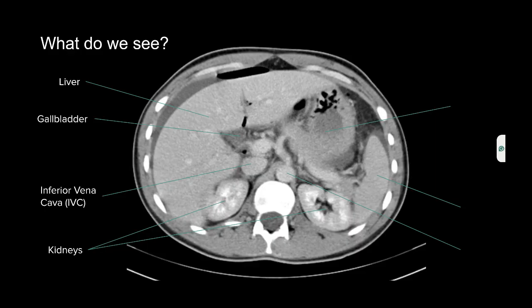Now, to our patient's left, at the top, we have our stomach. And then down a little bit lower to the patient's periphery is the spleen. And then this vascular structure near the center is a pretty important organ, and that's going to be our aorta. So all of this is in their normal spot, but what is the pathology that could explain this patient's abdominal pain? Well, the abnormality is going to be this free air that we see. So we see a number of spots of free air, but we've highlighted some of those bigger portions here in red.